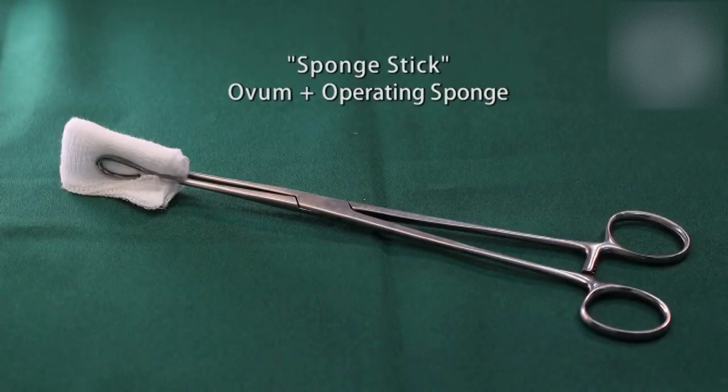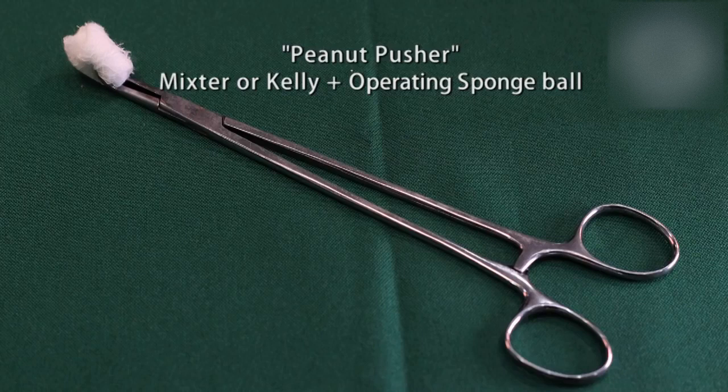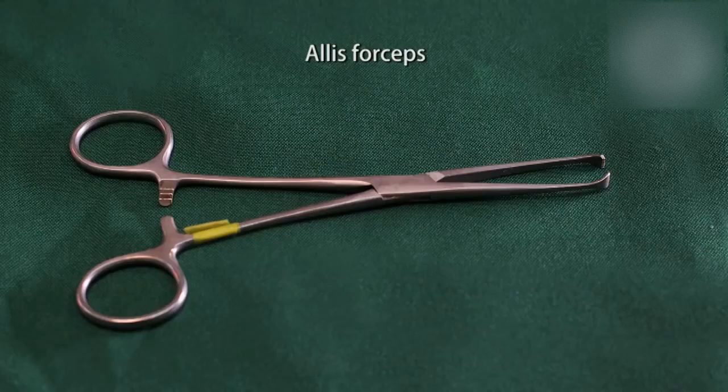Ovum forceps, sponge stick, ovum plus operating sponge, for blunt evacuation of blood clots such as in exploration. Mixter forceps, peanut pusher, Mixter or Kelly plus operating sponge ball, for blunt dissection. Babcock forceps, for grasping hollow or visceral tissue. Allis forceps, for grasping connective tissue.